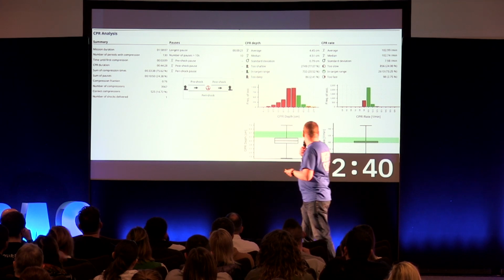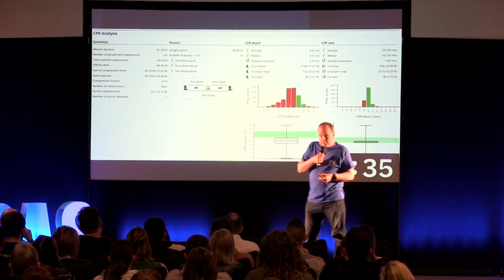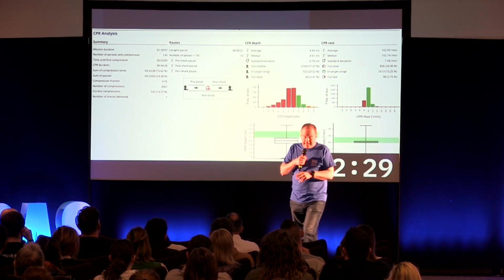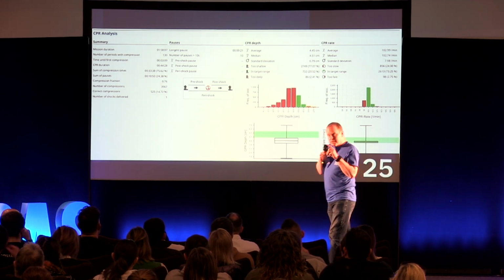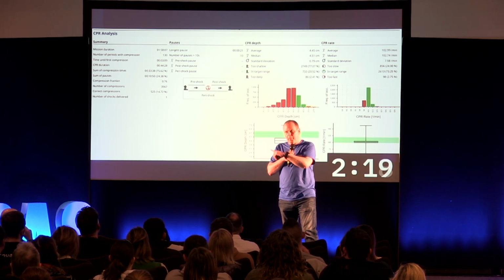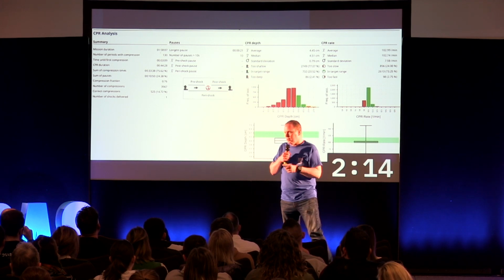Another one, you can see, looks a little bit different. There's more red there, showing something's not quite going right. This time, our CPR depth is maybe not quite so good. Again, looking at the left-hand side, compression fraction, 0.76, actually exactly the same. Exactly the same amount of time on the chest as the previous case. However, this patient probably isn't getting the same quality of resuscitation as the first.